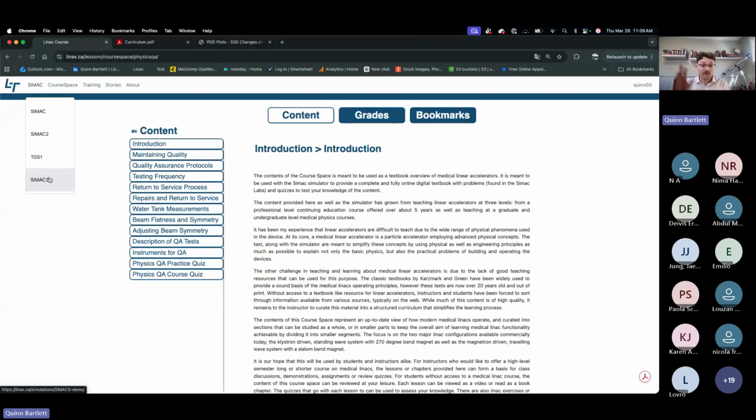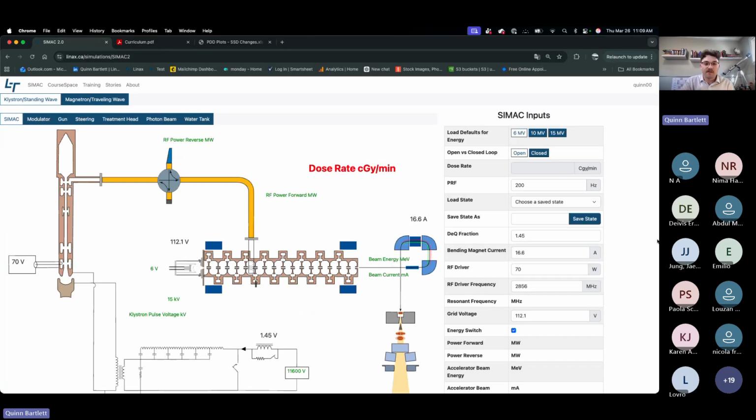This is a sneak preview for anybody in the webinar today. This actually just got added to the tab today. So SIMAC 3 is on its way, but I'm not going to dive into that today. You'll have to wait for another webinar on that one. And today we're going to dive into SIMAC 2.